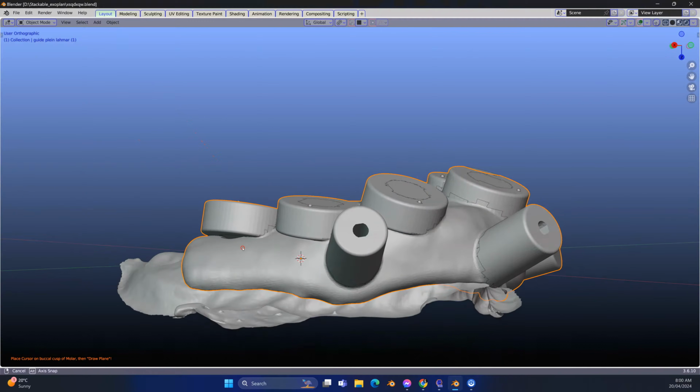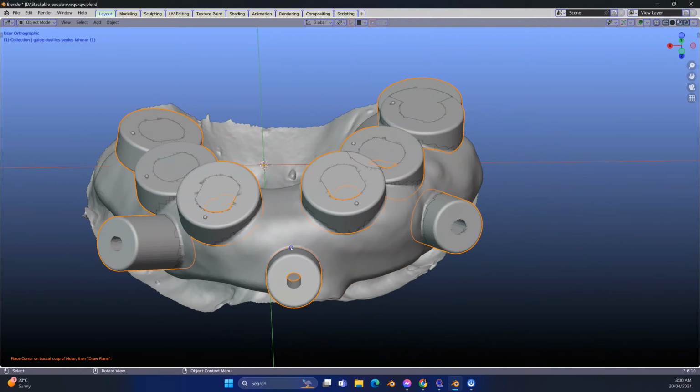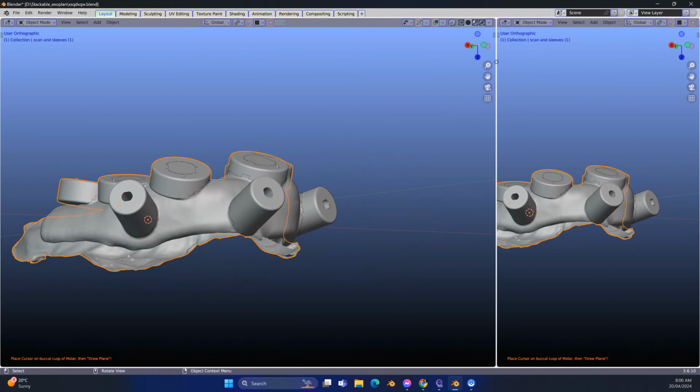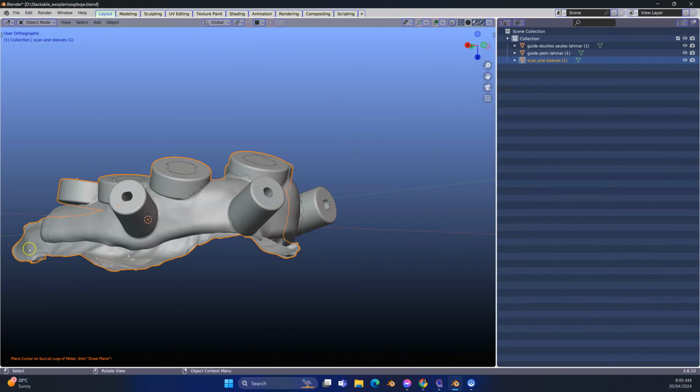In this video, I'm going to demonstrate how to make a stackable guide using an Exoplan guide. So, first of all, we're going to hide the models that we don't need. Open the outliner window and M to move. So this one we don't need at the moment. M, new, hidden.